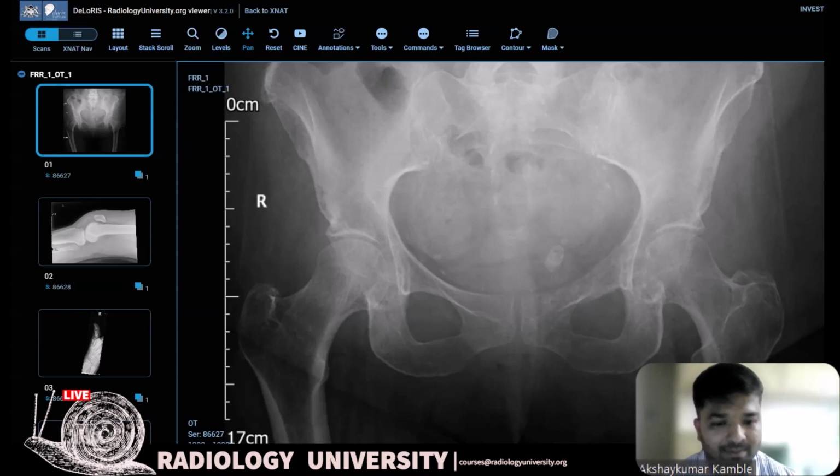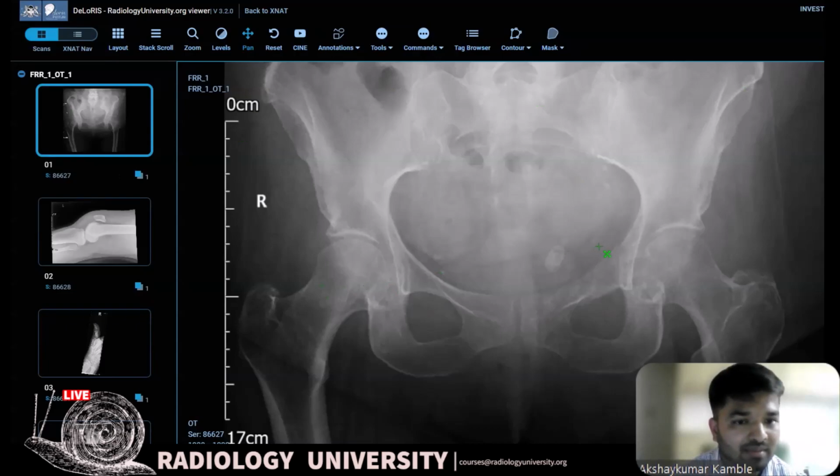So I'm presented with a frontal radiograph of a pelvis. The left femoral head appears to be sclerotic with some lucent areas, giving evidence of avascular necrosis. Left femoral head, you said. Yeah. Is there anything more striking?